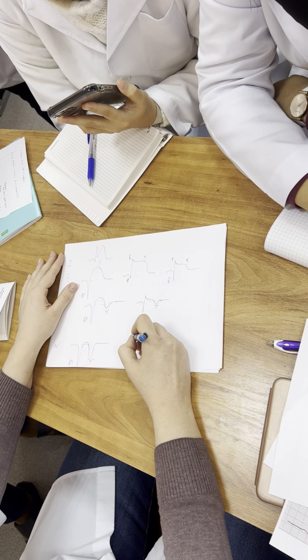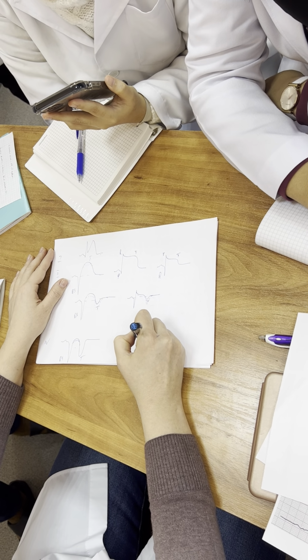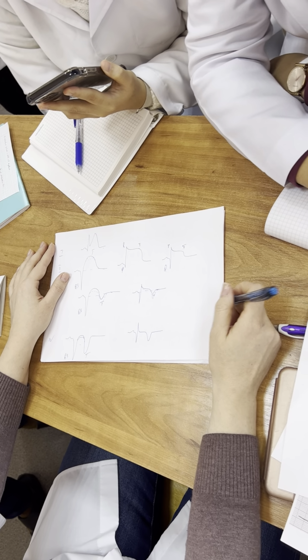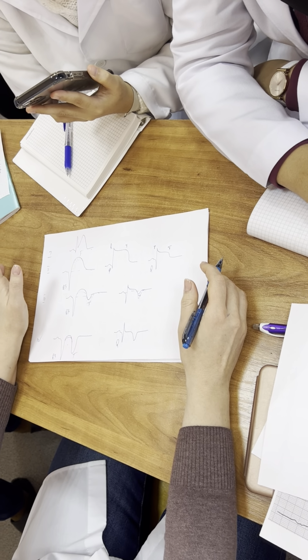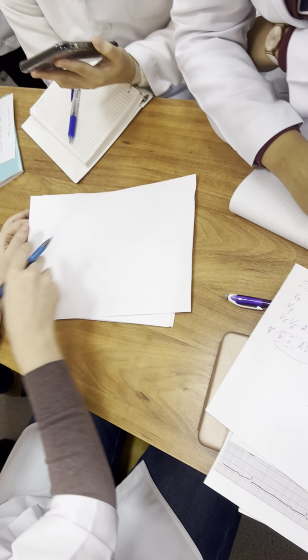Understood? How can we understand that we have start of scarring stage? ST normalized, T negative. Pathological Q will be there for some years. Understood? It's QMI.